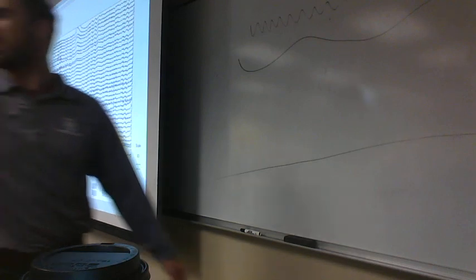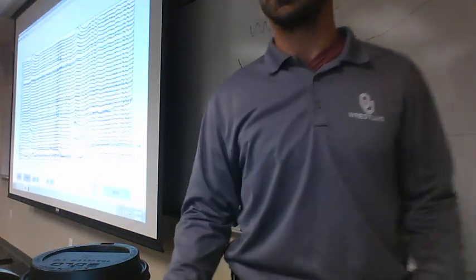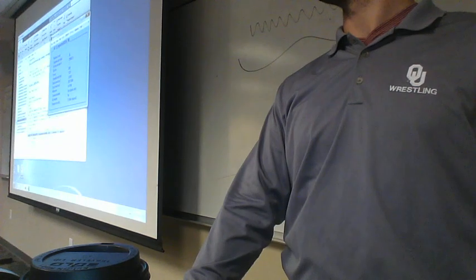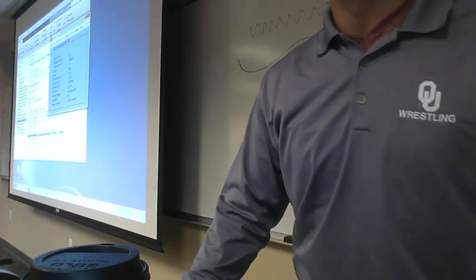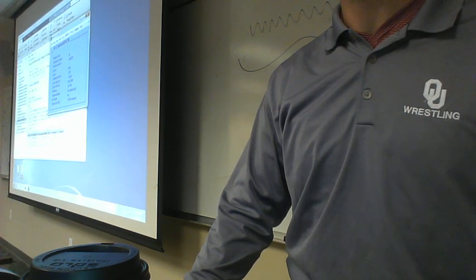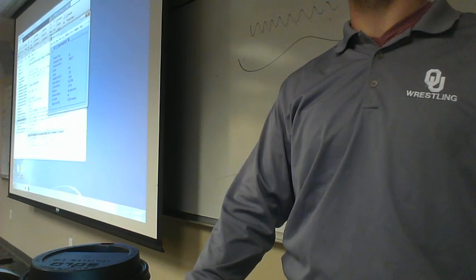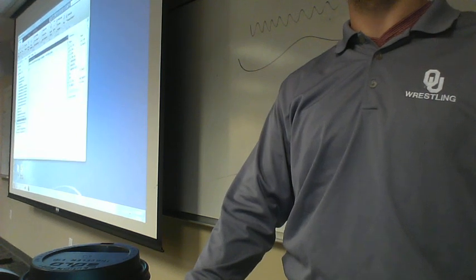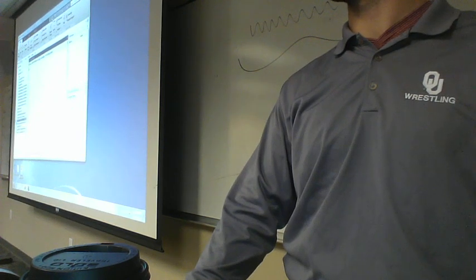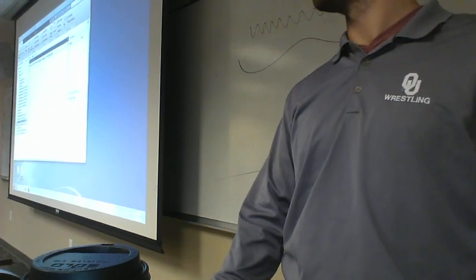Well, so you froze. Let's pretend that mine is frozen too, and I've got to rerun this. This is going to answer your question I said we would come back to. What do you mean by rerun this script? Okay, let's take a look. I will X out of here. You guys can just watch what I'm doing. I will do my little shortcuts. I'll CLC. I will clear all. Watch what happens in my workspace on the right. Now I'm screwed. Data's gone. Clear it all out. Everything we just did, SOL.